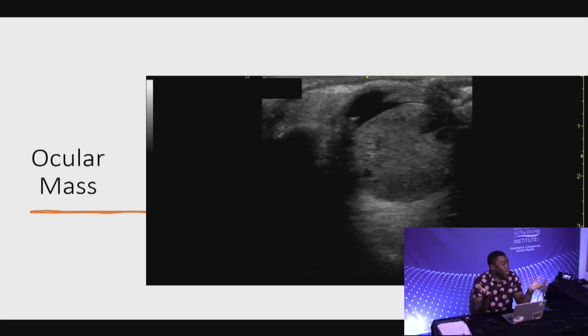This dude had an ocular mass that had been growing for a while. So his story did not match what he typically said. Opto was still called and all that, and they pretty much said the same thing. They're like, this guy has had decreased vision for a while. This is not something that just started. So you're still using your clinical judgment when a patient is telling you something, with what you see on ultrasound, and trying to put the pictures together.